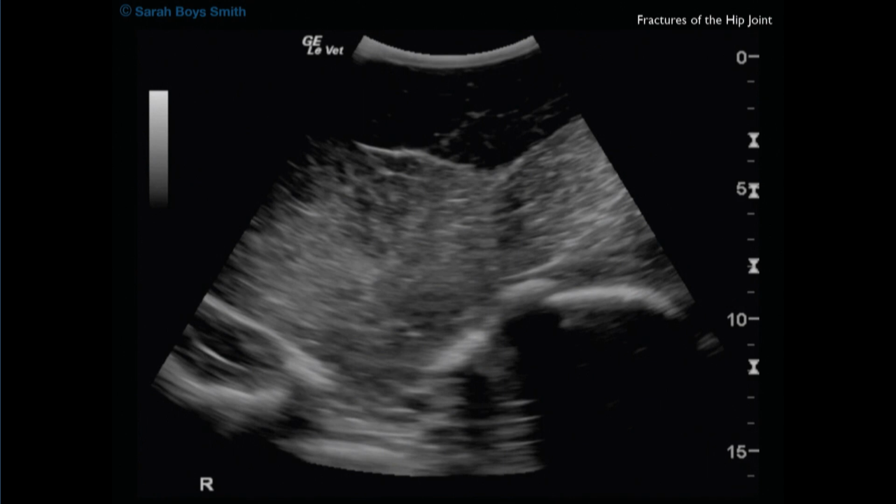So it is very important to join those two imaging modalities together to make sure that your ultrasound can back up your bone scan, and your bone scan can back up your ultrasound to determine the significance of your ultrasonographical findings, and also make sure we don't miss out on these ilial shaft fractures, which, as I said, can be catastrophic.